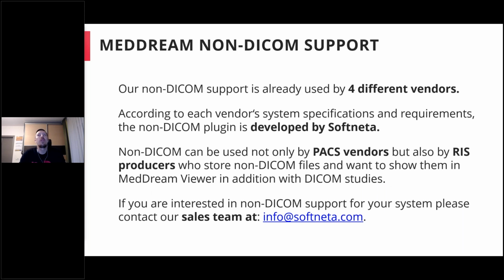To tell more about this non-DICOM support, actually it's already used by 4 different vendors, and this non-DICOM support is based on the MedDream plugin.